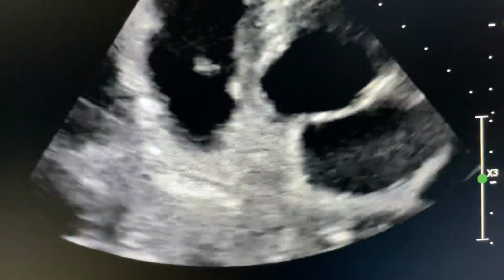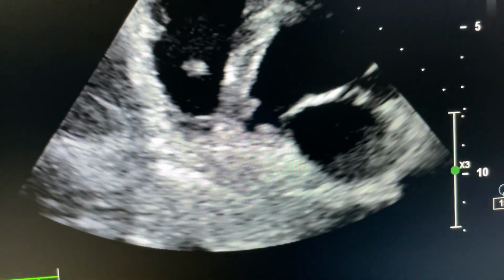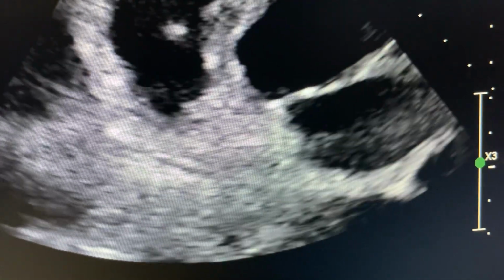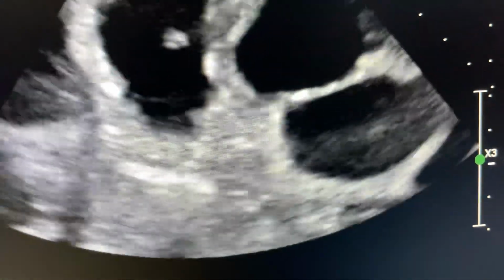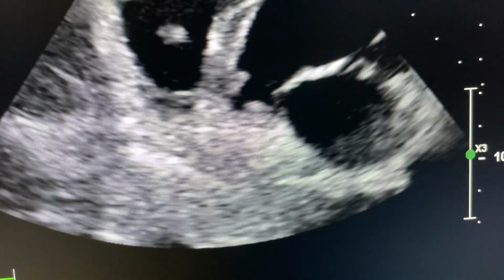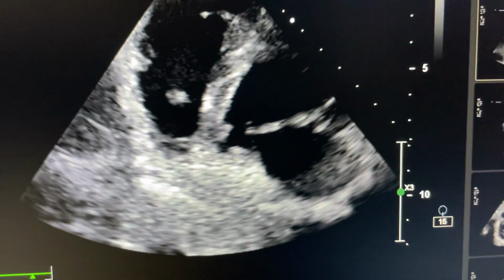One moment, you can better appreciate. See this wall. So this one. Now you can see this one.